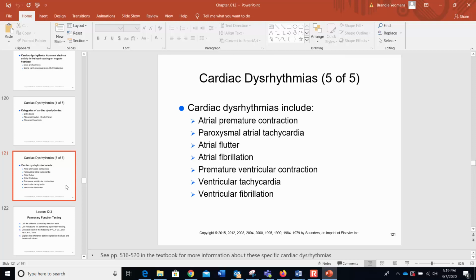Your QRS complex is widened, and there's no P waves present. So in my opinion, it looks kind of like somebody has just taken a pen and gone up and down in a kind of smooth rhythm, almost like a lie detector test, if you've ever seen one of those, where the distance between the going up and down is tight. So it's not real bad scribble scrabble, it's just like woo-dee-doo, moving around the pencil. So it just looks like an easy scribble scrabble, if you will.